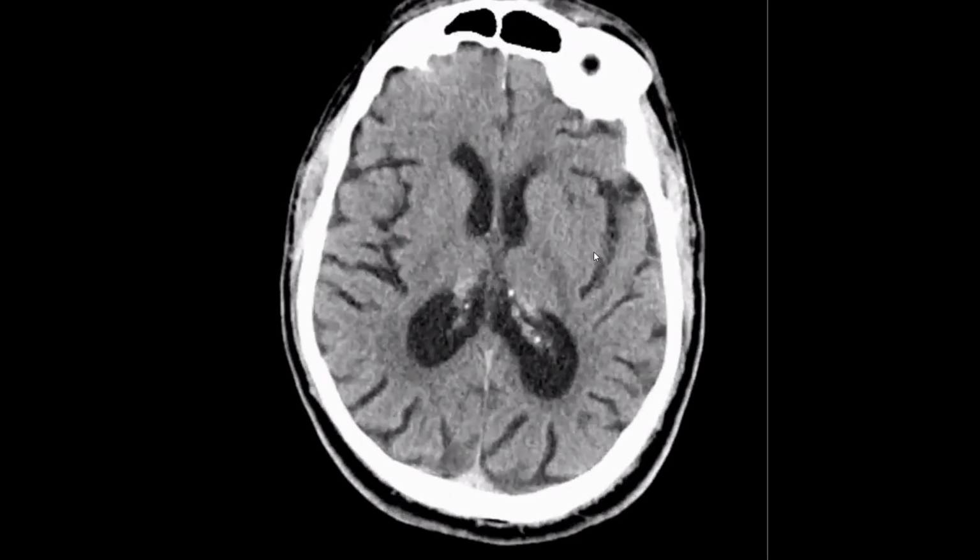Go on. We have here a 45-year-old patient with loss of consciousness.